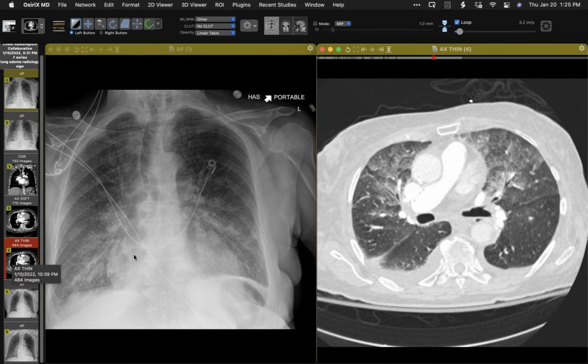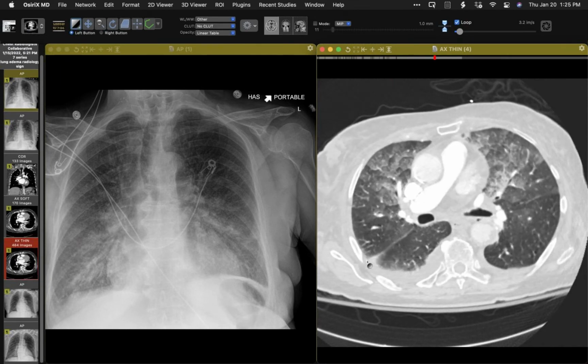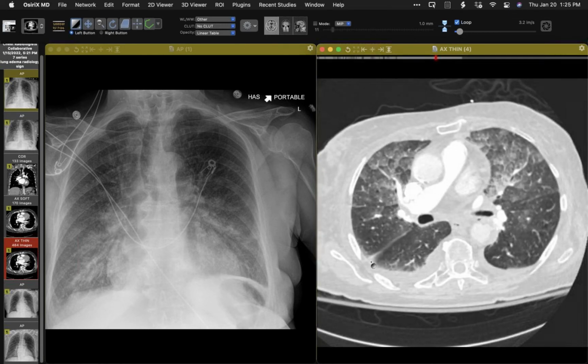It's good that you're showing this case, because I'm seeing a lot of this. I think it's important to be able to make the distinction, because now a lot of patients are showing up with lots of ground glass, and the junior residents and trainees' first instinct when they see diffuse ground glass is to question COVID. So we've seen a few patients that have COVID positive tests. They come in COVID positive, but they have an appearance like this, and it looks much more like edema than COVID.